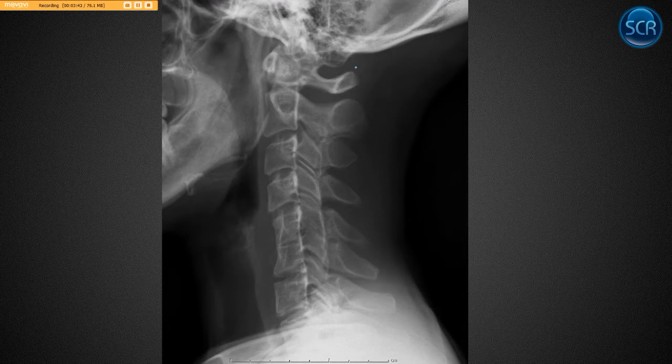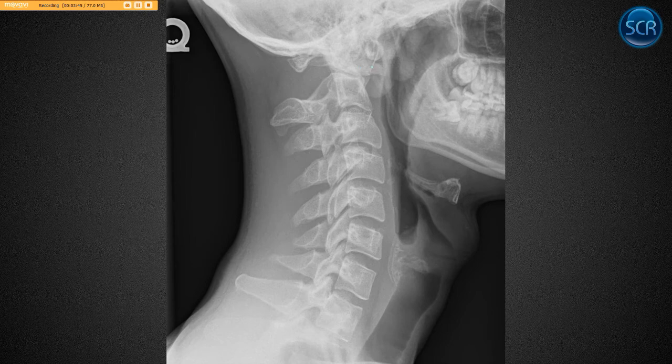This is normal space. And so we look at this, and then we see they have an enlarged atlantodental interval. Their anterior tubercle is kind of somewhat segmented here, and you can see that's enlarged. So going along with their occipitalization, they have agenesis of their transverse ligament. And so you can see their central canal diameter here, if we go from the spinal laminar line back here to the dens, is much smaller than we'd expect it to be down here at C2. So, maybe 30% loss of space or something like that.